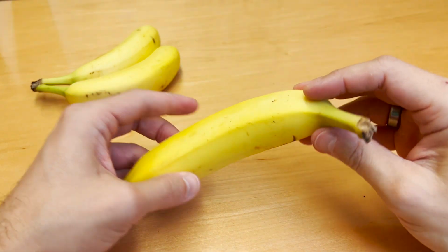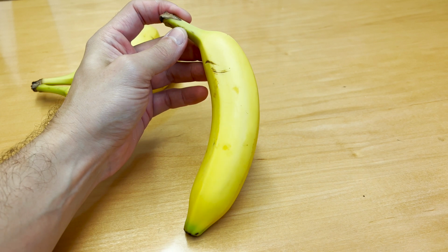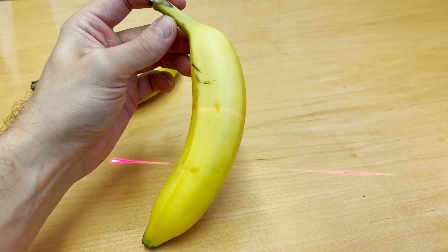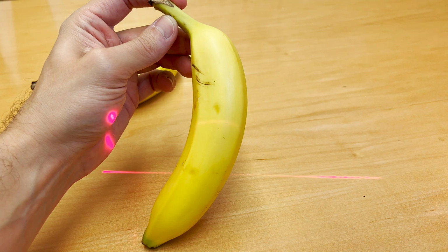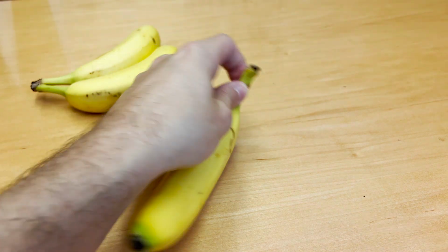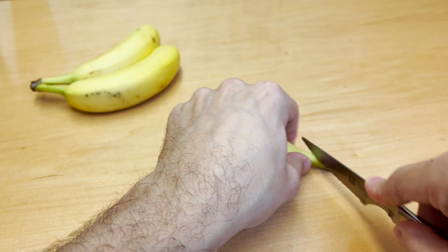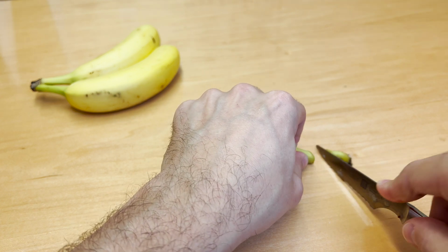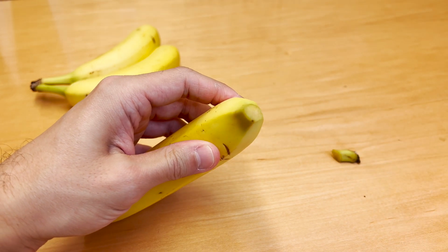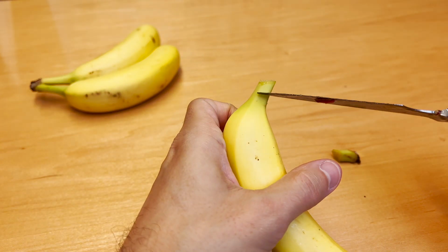Okay, so now we'll start cutting the banana. So let's start off pretty easy. We're going to just hold the banana still in this orientation like this, and we're going to make some cuts through it just like this, just kind of a cross section like that. And we'll see how the banana changes as we move down it. So if we start off at the top here, if we just get a cut through the stem, the only thing we're going to see on the image is actually that small little part of the stem, that small cross section of the stem there, just like that.